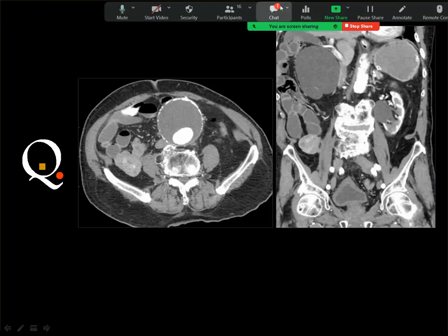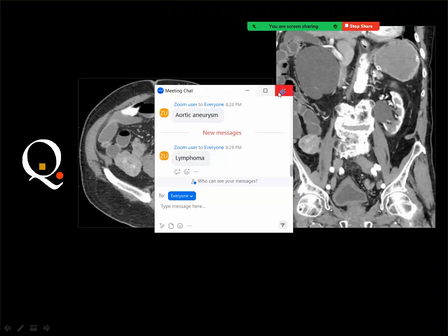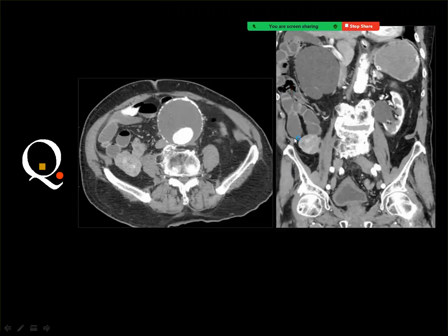Okay, if you are confronted by a lesion like this, when you are not able to adequately locate the lesion, whether it is in the mesentery or it is in the bowel, then if it is in the mesentery, it will represent a carcinoid tumor.